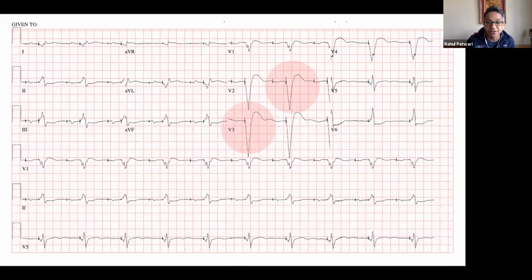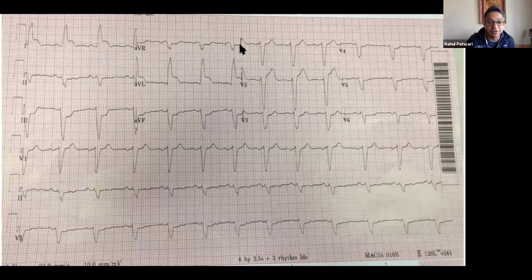So let's look at this EKG again. And when you do see it here, now you can say, all right, if you're using the modified Sgarbossa criteria, this one maybe is it 25%? So look, it's probably 1.5 big boxes. And then this is really, let's see, 1, 2, 3, not even 4. So yeah, it's more than 25%, right? And so we hit that extreme negative discordance rule. And the same thing here. I just wanted to give you a picture of the positive concordance one.